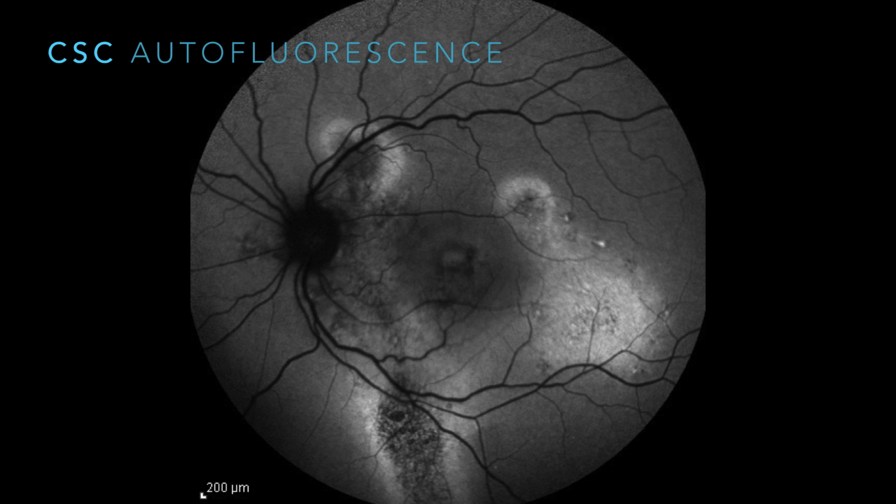So that section down at the bottom, we call this guttering, by the way, when you see these troughs of fluid that have this gravity-dependent distribution. That guttering isn't specific to central serous, but it tends to happen only in things that cause chronic subretinal fluid that tracks inferiorly. So you can get the occasional choroidal nevus that does this.